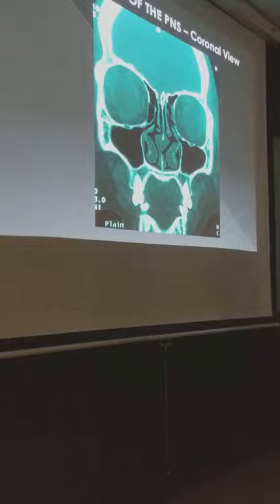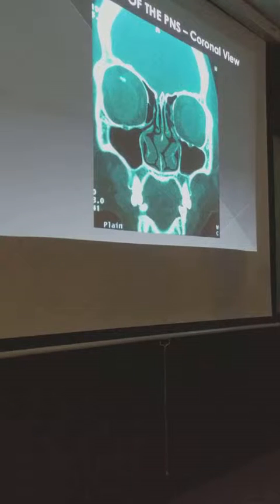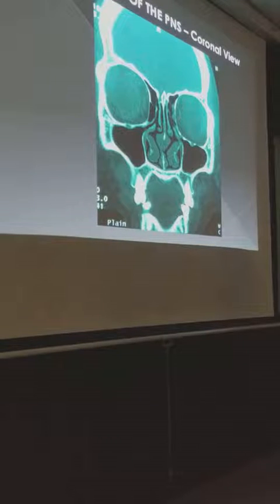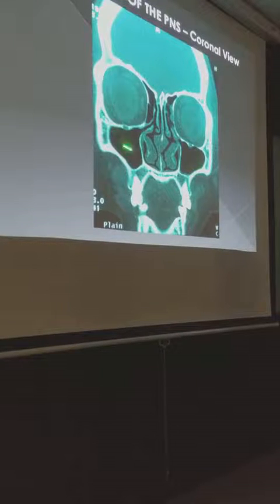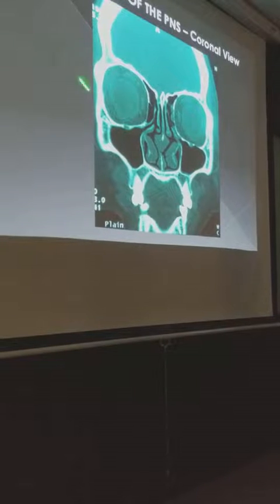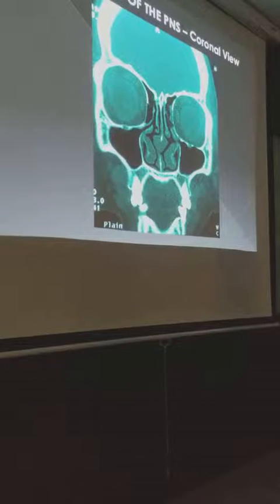Is that the next? Okay. So you can see, when it came to the osteomeatal complex, dikit-dikit na tayo. Di ba? Kanina, ang laki ng talon. So, same thing, no? You have your turbinate, maxillary sinus, infraorbital nerve, orbit, skull base, okay? Skull base, roof of the ethmoid, fovea ethmoidalis, di ba?